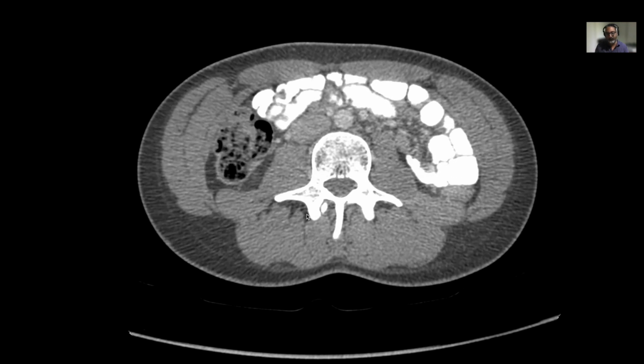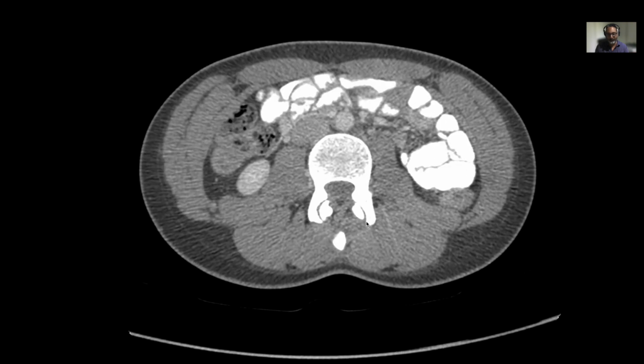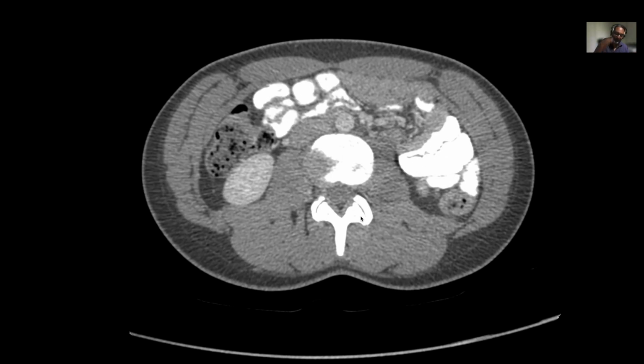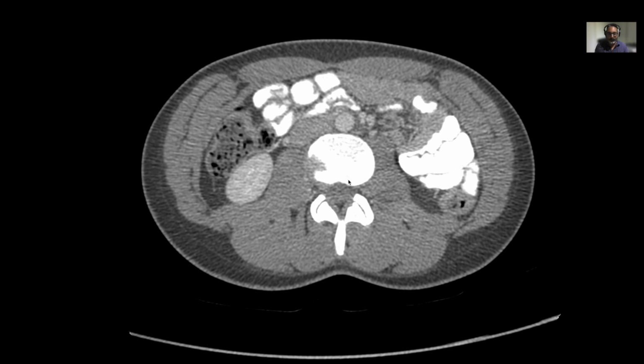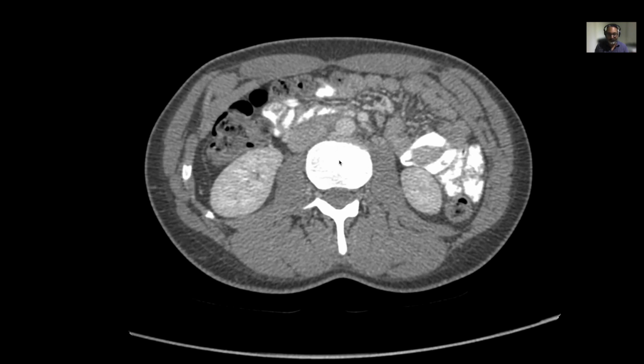In the lumbar vertebra, you see these superior and inferior articular facets much better. That's the joint with the vertebra below. So you see those facets much better. I'll show them to you again in the sagittal section. They're seen better over there. And one thing, when you're passing through vertebra and it becomes gray like this, that is actually the intervertebral disc.